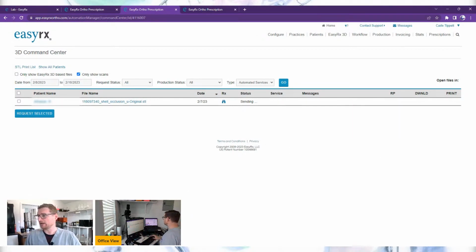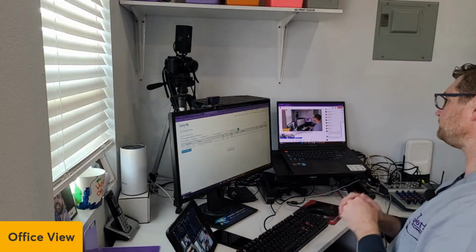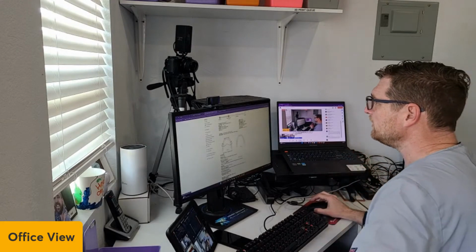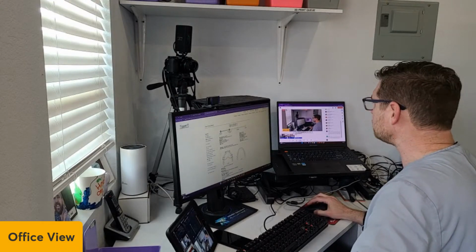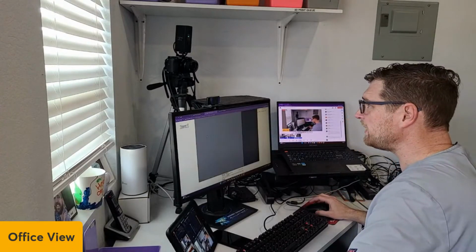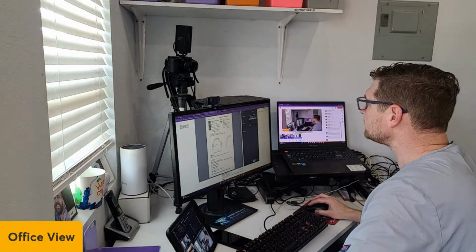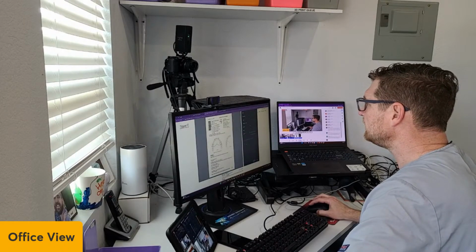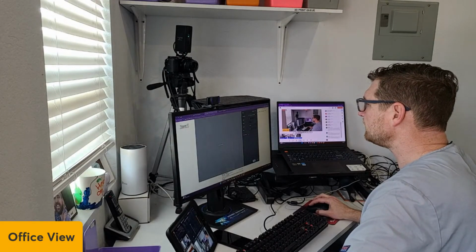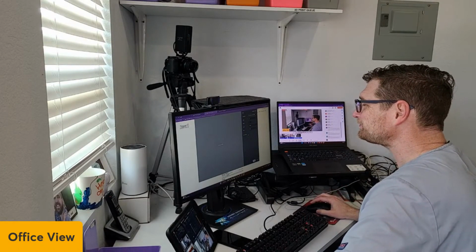So let me again show this screen. I've got to go back. I'm going to click the back arrow and go back to the thing here. Up here in this right corner, hopefully you can see it, is a print button, and I'm going to print the paper, and that is trying to send it to my Zebra printer. Here we go. I'm using a new browser, so it's actually kind of slow on me. There we go.